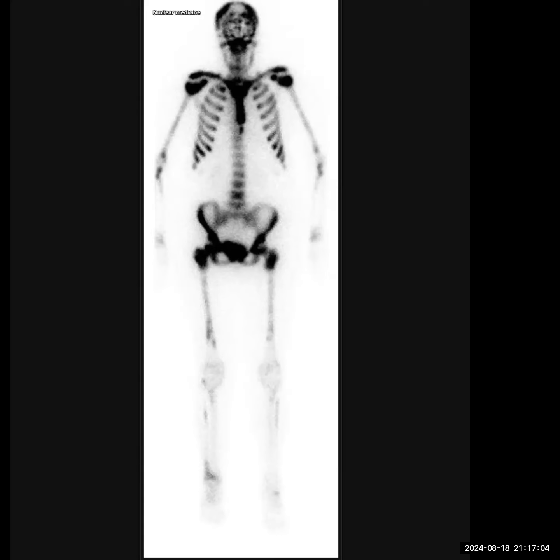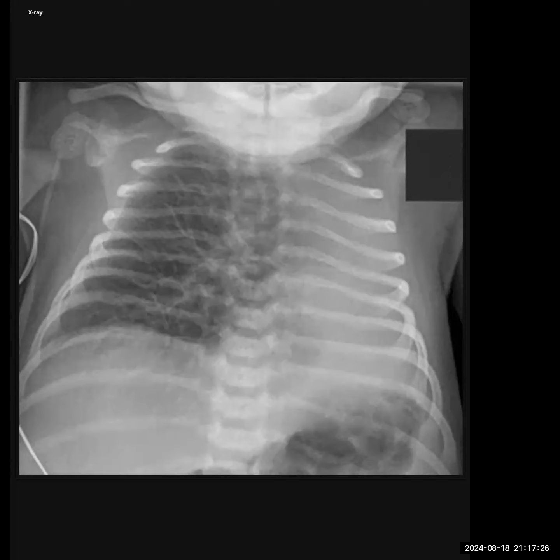I can't see any breast region uptake. I can't quite see the prostate area because, okay. I can't see renal excretion in this. So I'm suspecting this could be a superscan, metastatic superscan. Okay, so we'll just go on to the next one.